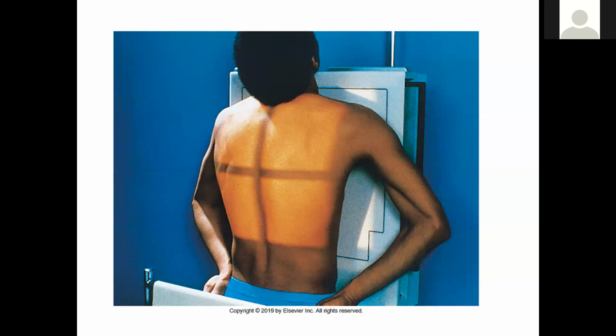side of interest. If you have a larger patient where you cannot see the skin line because of adipose tissue, then you should keep an eye on the humeral head. As you can see, there are no ribs extending past the humeral head. So you can collimate to that point and rest assured that your ribs will be included.